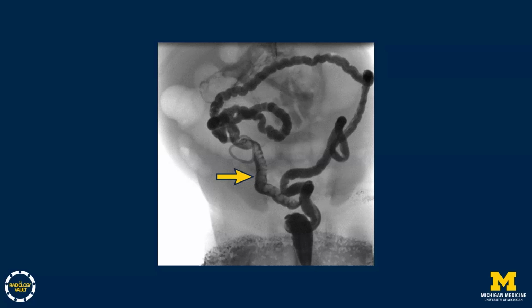In fact, with total colonic Hirschsprung disease, you often have easy reflux of contrast into the small bowel, including into the dilated loops, and a foreshortened colon. So not only a microcolon, but it'll be foreshortened such that it will sometimes look like a question mark.